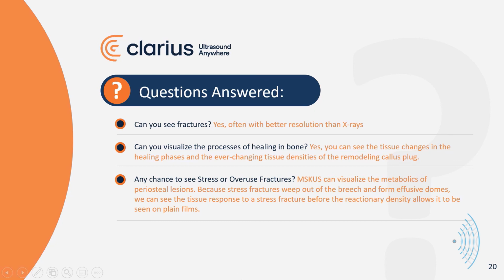Any chance to be able to see stress fractures or overuse fractures? Well, in fact, we can see stress fractures faster than you can see them on plain x-rays. That was documented in that mega marathon runner. We were able to document the existence of a stress fracture 10 days before we were able to see it on x-ray. Isn't it cool to be able to say, yes, you do have a stress fracture? And it's not just in the calcaneus. We can see stress fractures in the base of the fifth metatarsal and in many of these common locations to identify you better slow down and take it easy or this is going to develop into something even worse.